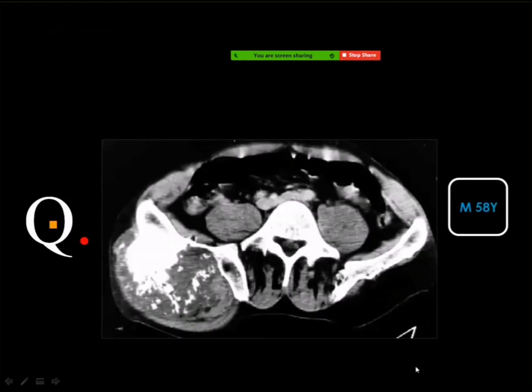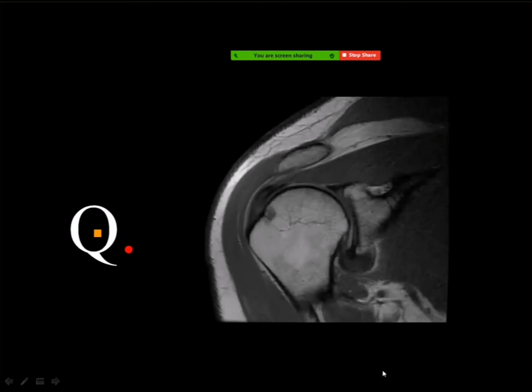And this is a CT scan of the chondrosarcoma. Yes, very good, chondrosarcoma. This is chondrosarcoma because of the mass with the malignant criteria containing calcium. The possibility of chondrosarcoma should be considered.